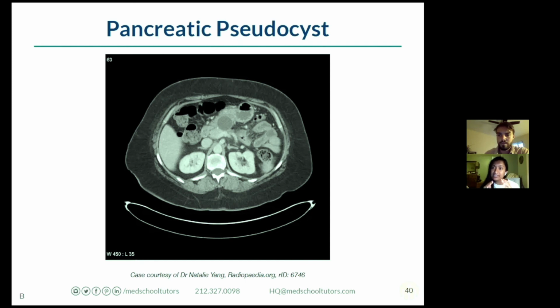You don't really get cysts in the pancreas. You don't ever actually see just simple cysts in the pancreas. What you'll see is a pseudocyst as a complication, and you'll see other precancerous lesions, but those are much more suspicious looking than this.